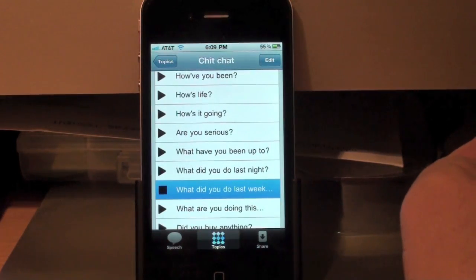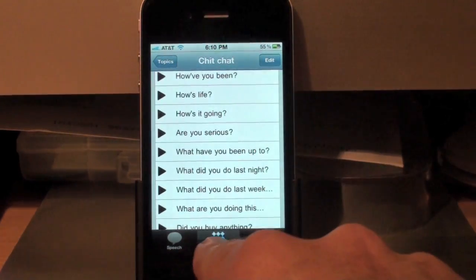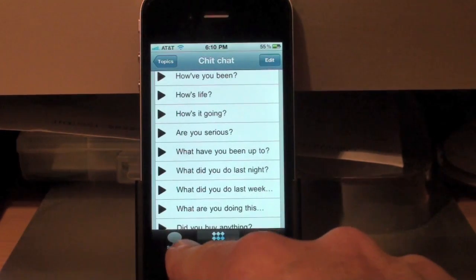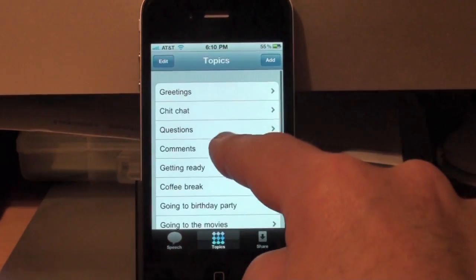What did you do last weekend? What have you been up to? So I can speak just from here. Again, that's under Topics. So instead of using that speech text box area I showed you just a moment ago, just click here on Topics and you can do all your communicating right from within your topics.